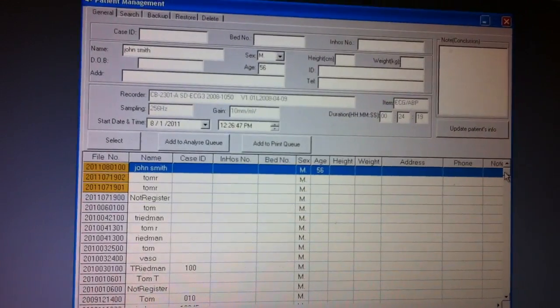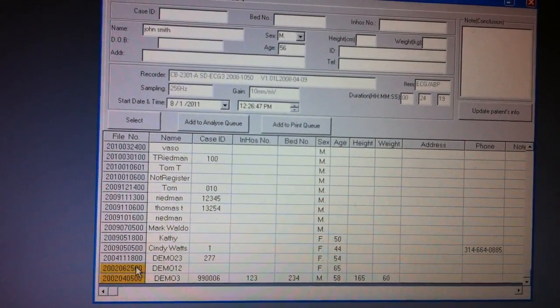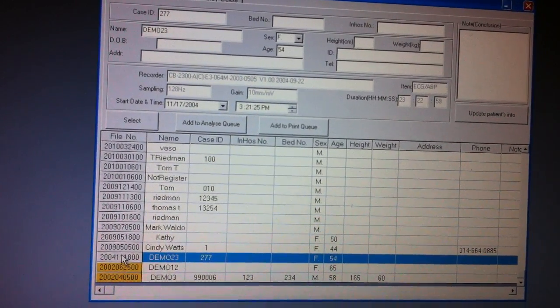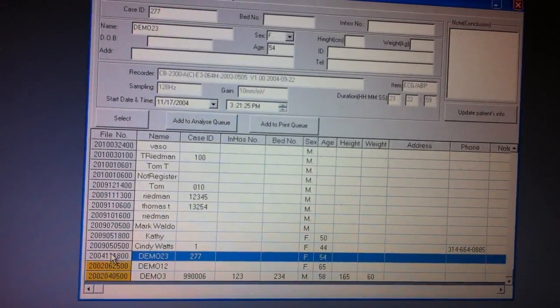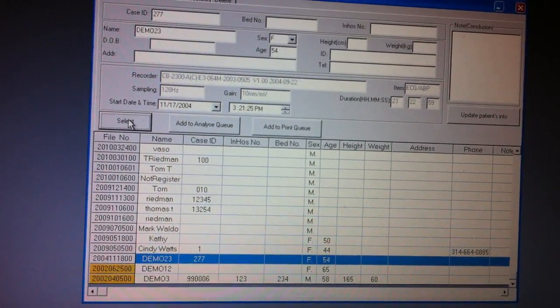When setting up and installing the software, it's best to install the complete version so that you'll have access to demonstration software, which allows the user to learn the various functions and features of the software. We select the patient. The screen goes back to the gray and the two menus up top, and then we go to the Analyze.